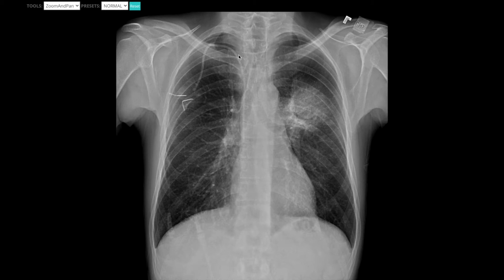I'll have other videos talking about all the different lines of the mediastinum, but essentially you want to make sure all of these are very crisp and not significantly enlarged in any particular location. Anytime you blur the right heart border or the diaphragm, it may signal something in the right middle lobe or the right lower lobe. Same thing with the left heart border as well as the diaphragm.